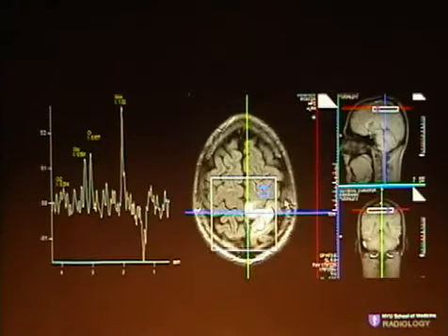So then we looked at a normal voxel sitting in normal brain, and you see that even within normal brain, we were seeing some lipid and lactate. So we felt that this is a little weird, and we went back and looked at the VOI that's placed, and you see that in the large VOI, the edge of the voxel is actually overlying scalp fat and diploic space fat. So any lipid that is normal within the extracranial brain will leak into the large VOI, and you'll end up seeing lipid within areas that are normal looking as well.